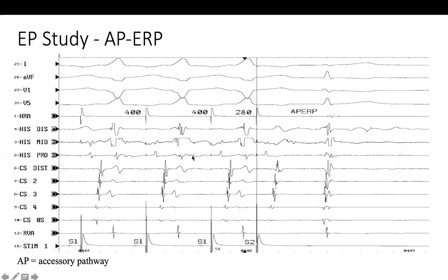I think we haven't seen this one. This slide, I think we have stopped last time on this slide. Who wants to take this slide? This is a little bit challenging.